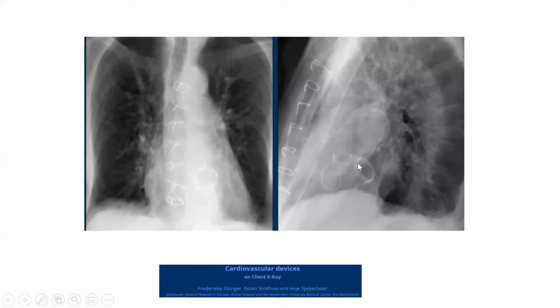What is this? This is mitral. Mitral. Very good. And this one? Aortic. Aortic. Very good. And this one? Tricuspid. Tricuspid. Exactly. Mitral what? Valve. Tissue valve. Aortic what? Tissue also. Yes. And tricuspid what? Ring. Ring. Thank you so much.